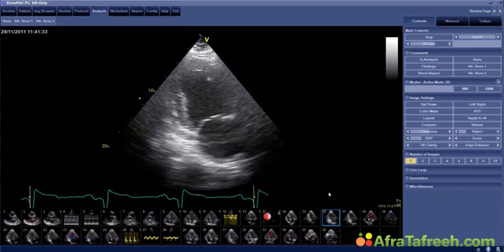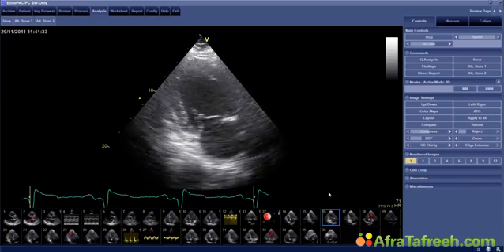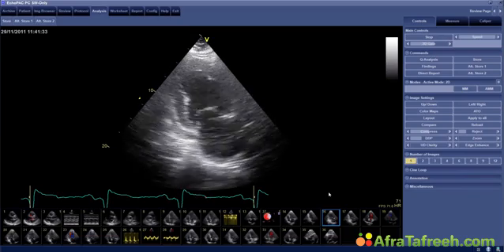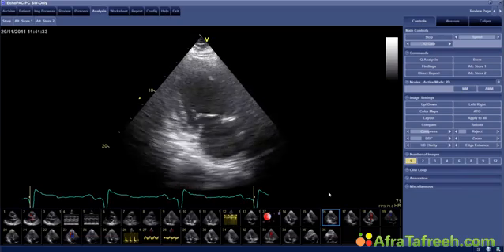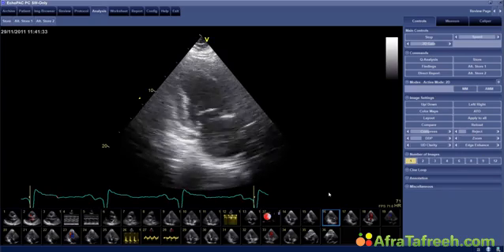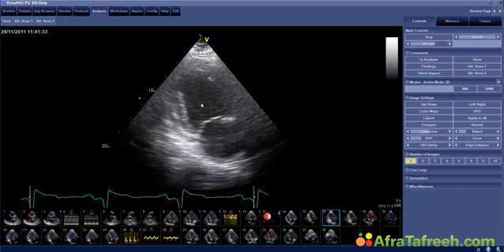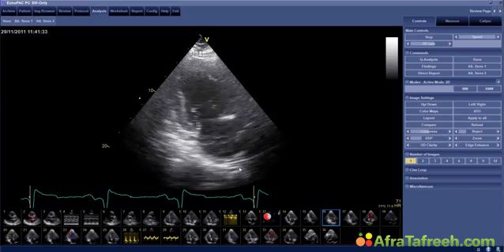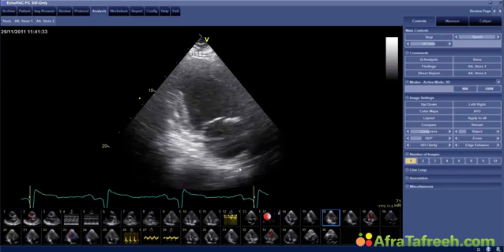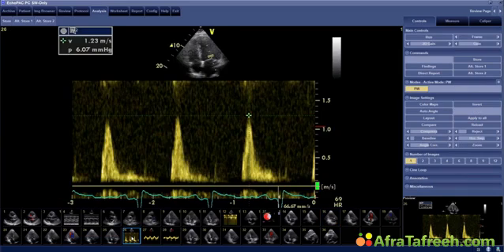One more thing, maybe a question that I would like to ask to the audience. How do you think the patient is doing at this point? Remember, he had dyspnea. Would you say that left ventricular function is reduced? Does that really explain his dyspnea? Well, left ventricular function is reduced, I would say maybe mildly reduced, certainly not more. And the question now is, does this mild reduction in left ventricular function really explain his symptoms? I want to show you one thing that answers this question.